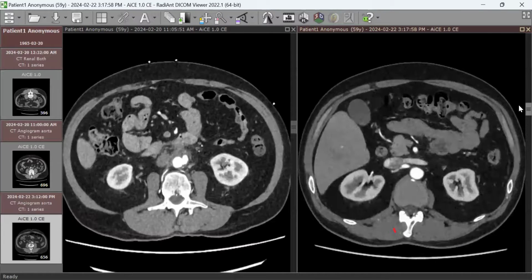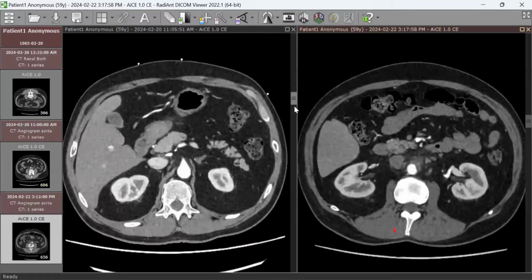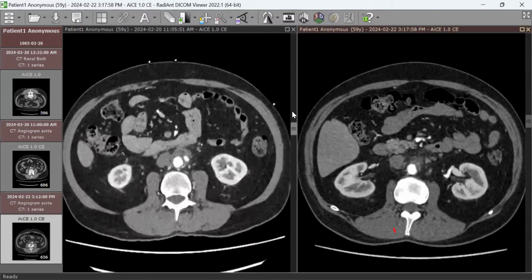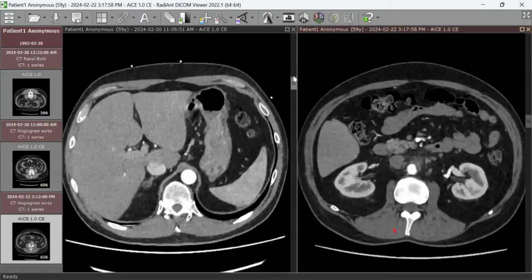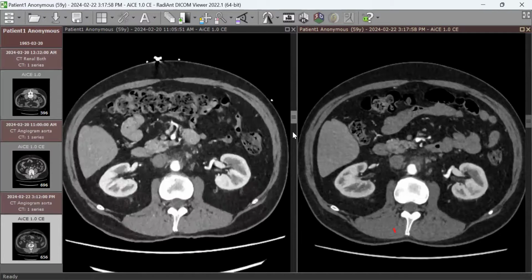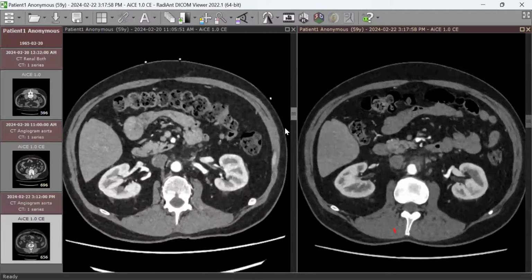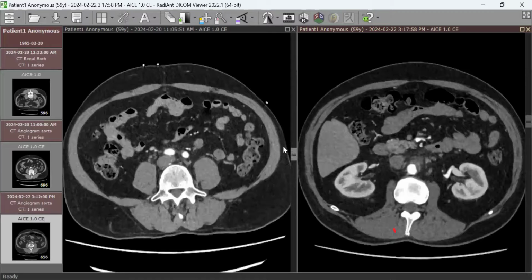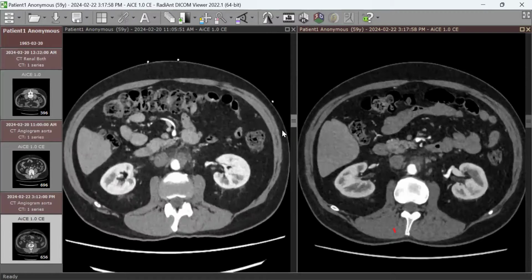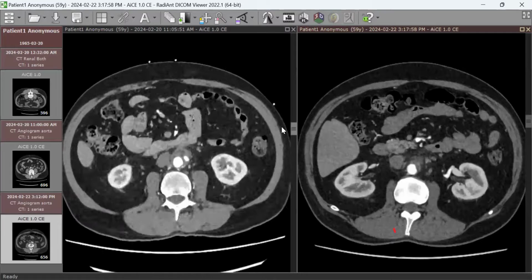Part of our analysis of the scan is to look for any infarctions related to emboli in other organs. We don't see any in the kidneys, liver, or spleen, and we didn't find any other manifestation. The major branches, including the superior mesenteric, look normal. You're right. Most likely this patient has mycotic aneurysm, with antibiotics before intervention. That's right. Thank you so much, Doctor.